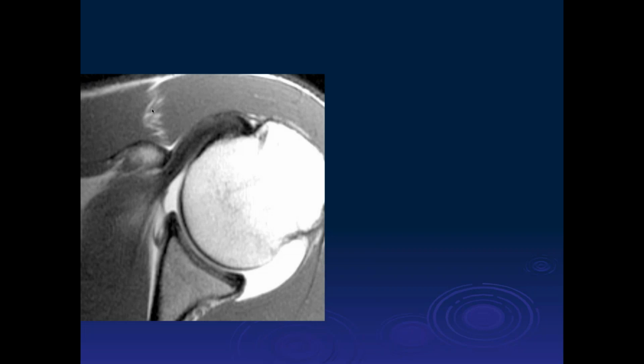This is someone who had an arthrographic injection through there. You also need to look at how laterally placed the coracoid process is. If it's inferior and laterally placed with narrowing of this space, then you have increased risk for impingement. You have to be a little bit careful, because if someone has superior migration of the humeral head due to rotator cuff tear, you may also get narrowing of this space, which may not necessarily be symptomatic. So that's the space to look for.